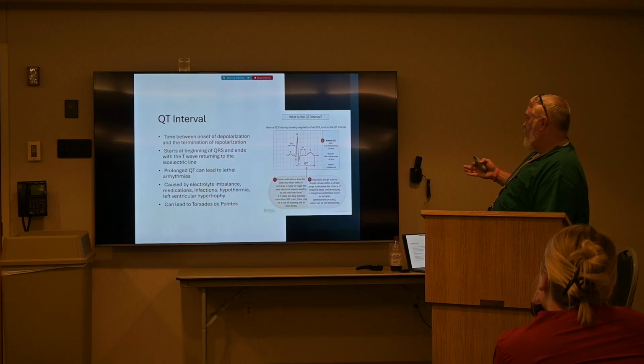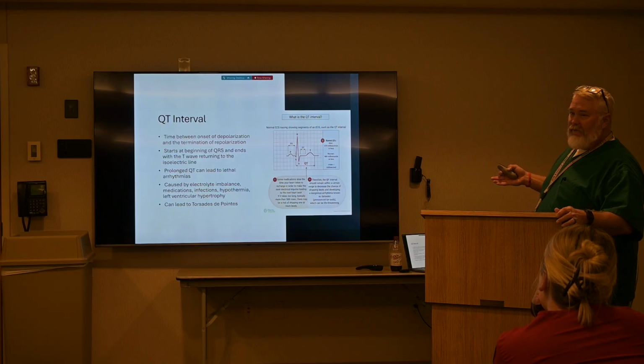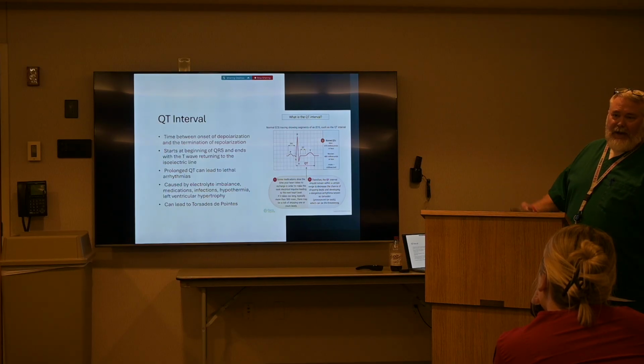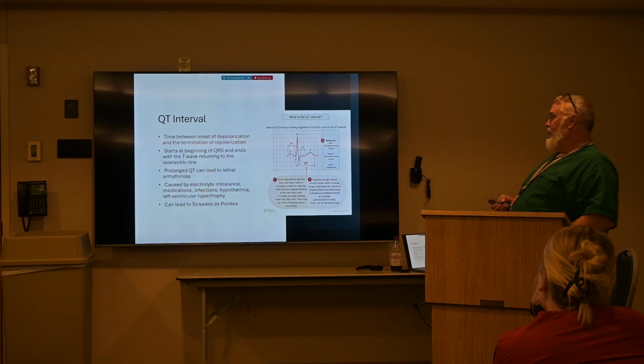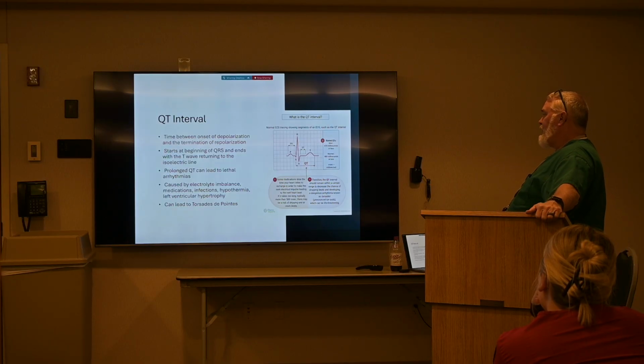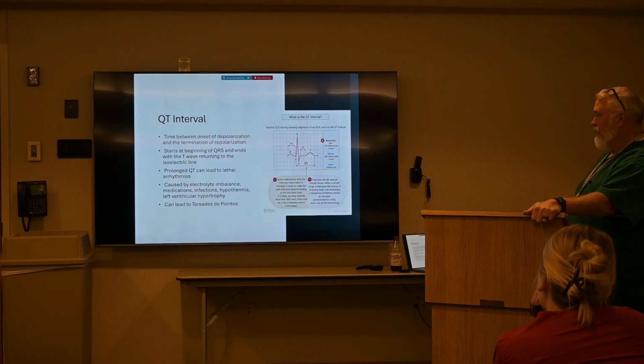So the QT interval. QT interval is important, especially with different medications that we utilize, different antibiotics, different antifungals, how medications interact with each other. This is something that you need to pay attention to. The QT interval is the time between onset of depolarization and the termination of repolarization. It starts at the beginning of the QRS and it ends with a T wave returning to the isoelectric line.